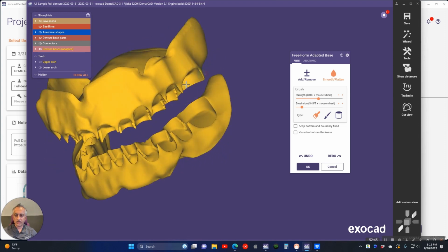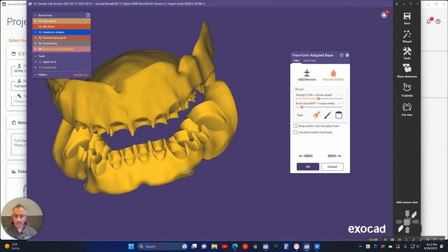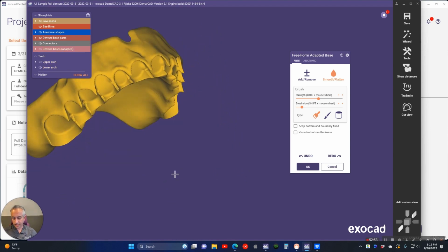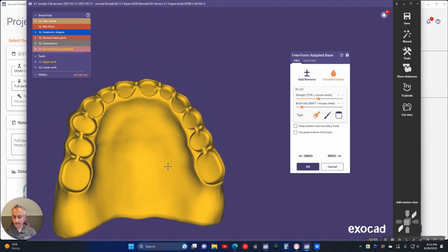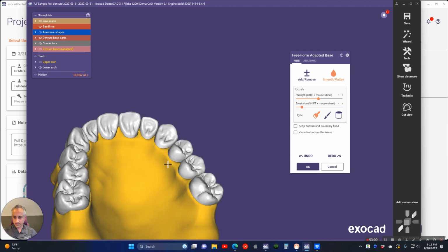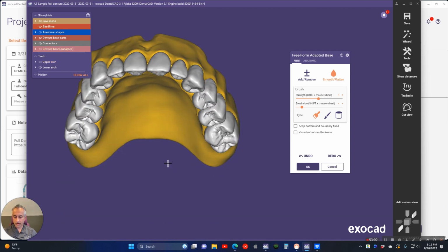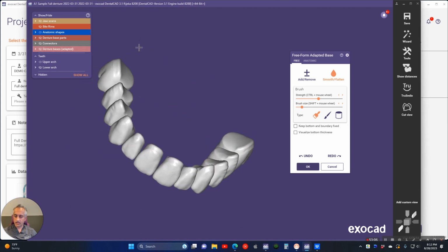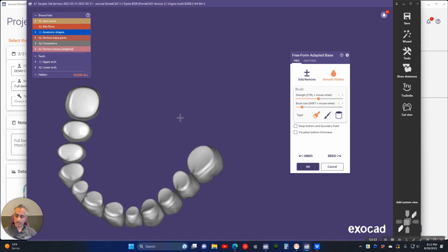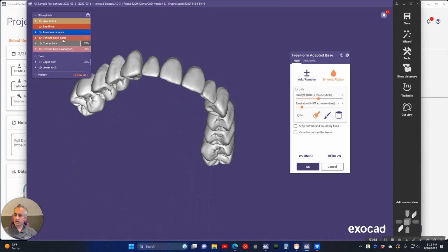Because either you do it now for a few seconds, or you're doing it later anyways. So you're spending time now or spend it later, I prefer to do it now. And that's how a denture base will cut. You can see it left some room for those connectors, and if I show my anatomics without my denture base, this is what we're going to end up looking like.